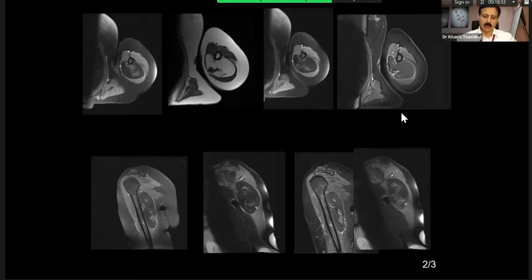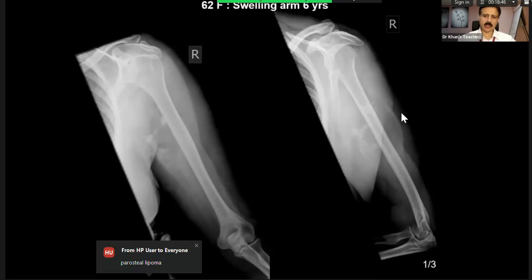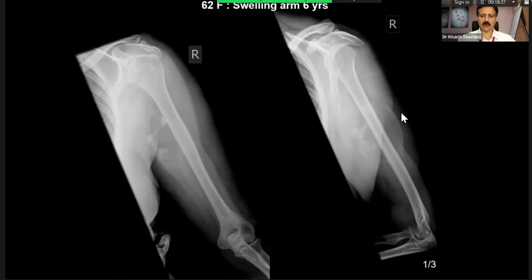Right. Okay. So you see, liposarcoma is an exam case, and both types have come in the exam. The first are lesions which are black and white, like this case, this is a definite liposarcoma. And second are lesions which are in the gray category. And how will you deal with them? Both have come in the exam. So this is a slam dunk, absolute, imaging wise, this is a liposarcoma. It gives you low density, then calcification here.